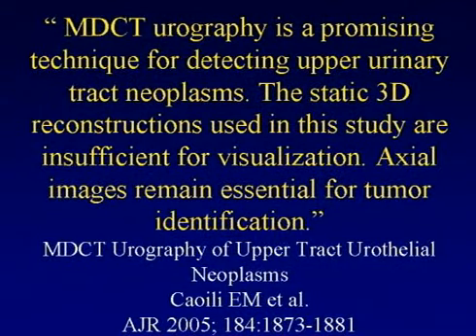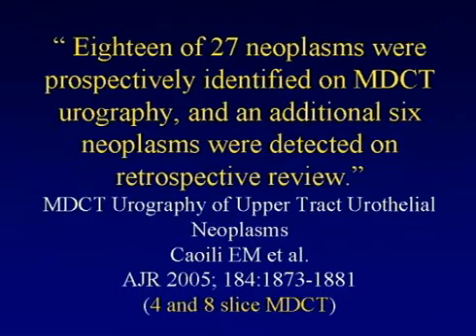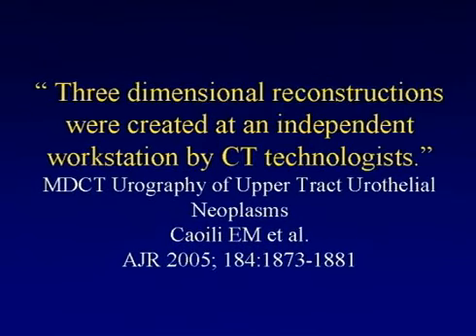One important thing to recognize when you look at the literature, here was a recent article talking about CT urography for looking at renal tumors, talking about how the 3Ds were not very good for visualization of tumors. You need the axial imaging. I wouldn't want to say that we don't look at the axial imaging, but I think what you have to think about is doing everything together. In this article, the other issue, forgetting the fact that it was 4 and 8 slice, was that all of the images were generated by technologists.